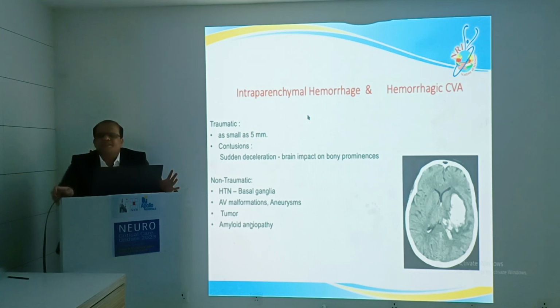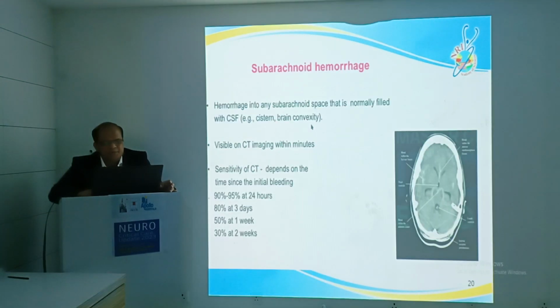So at the bedside, when we are seeing this image with the blood, we have to concentrate on the site, as well as how it is creating the mass effect, as well as the intraventricular extension. If this patient is having intraventricular extension and creating hydrocephalus, we have to go for the EVD also at the bedside. Involve the neurosurgery team and go ahead with the EVD.